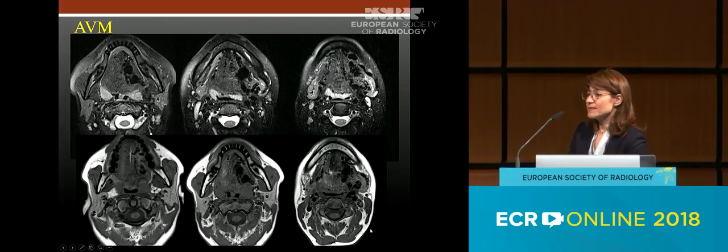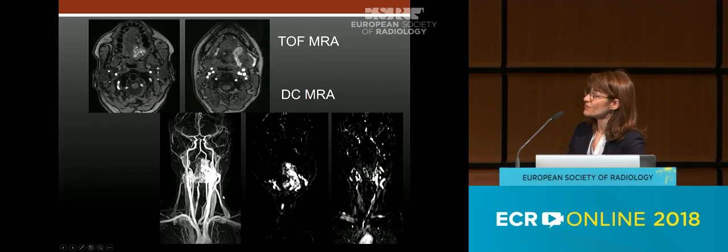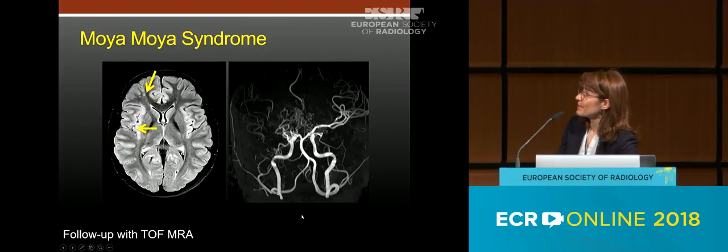However, in such cases like vascular malformations, if we want to see the dynamic pattern, the enhancement, feeding pattern of these lesions, then we should inject gadolinium and see dynamically the enhancement pattern of the lesions. Please compare that we can easily locate the nidus of the lesion on time-of-flight MRA, but we can see that it is fed by external carotid artery on dynamic enhanced MRA.